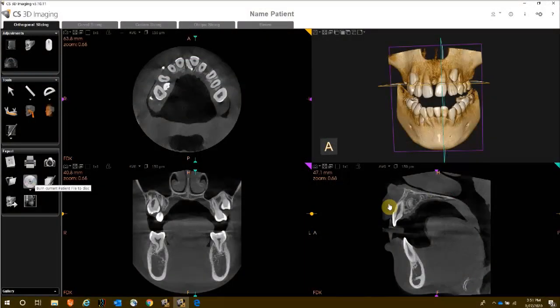Another icon I would like to go over is how to burn this patient file to a CD or to a USB. The icon I'm describing actually looks like a CD. If you are interested in burning this image to a CD, you simply insert that CD into your computer. Give your computer a second to recognize that there is a disk in there. Any type of disk will work, CD or DVD. Then you would click on the icon that looks like a CD.